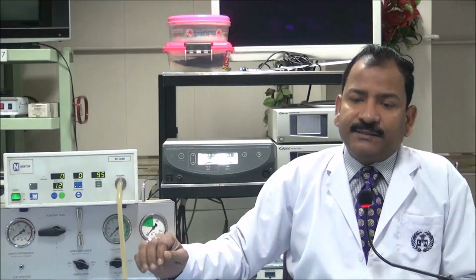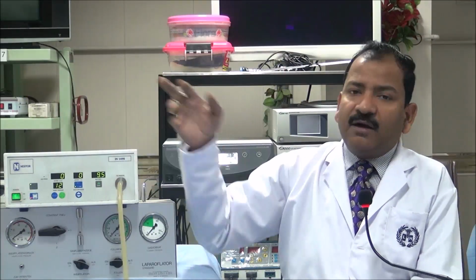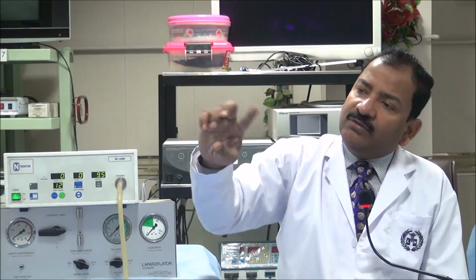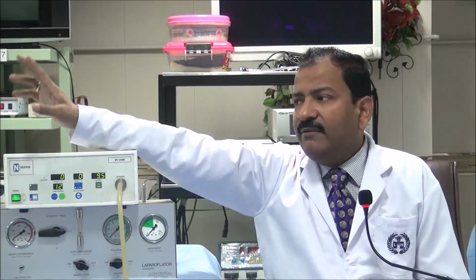Now the question is how I will know whether this insufflator is working correctly or not. Time to time you have to calibrate it, and calibration is very easy. Take the tubing and connect it with the BP instrument, a sphygmomanometer. This is the tubing from the sphygmomanometer, this is the cuff of the instrument with the dial. Then switch it on, and automatically it will give you millimeters of mercury. Because this is also millimeters of mercury, and that is also millimeters of mercury. That way you can calibrate it.